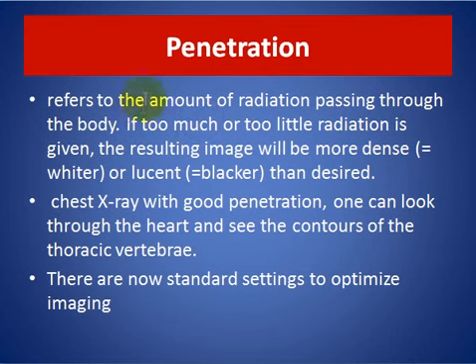Penetration refers to the amount of radiation passing through the body. If too much or too little radiation is given, the resulting image will be either black or white.